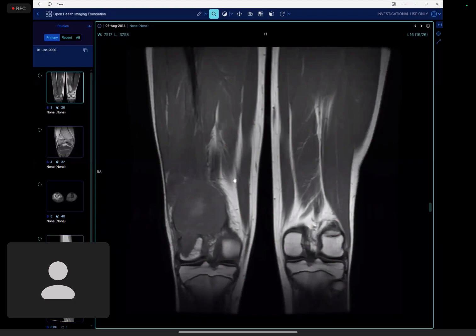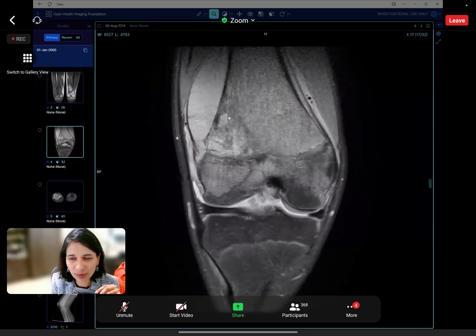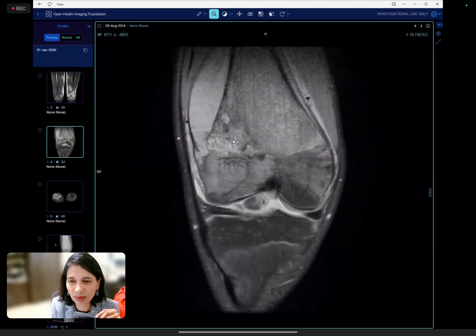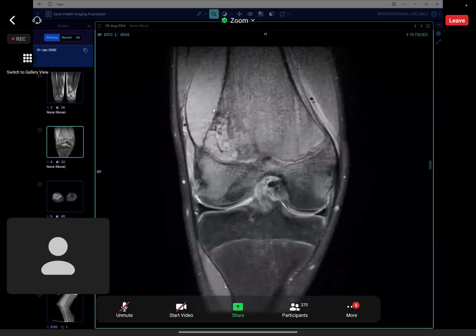Okay, so that is an osteosarcoma. The plain film interpretation was very good, because you got all the points. On MR, I think you can look at a little bit more cases. Just don't think that something that is fluid density is fluid. It can be a solid lesion as well. Okay, fine. So that is that case.